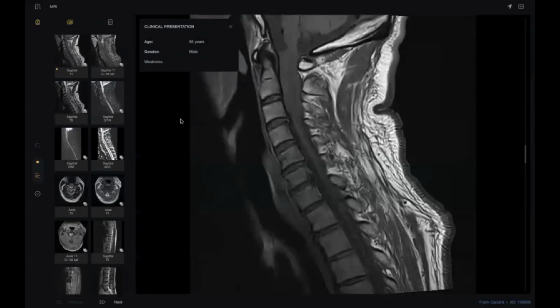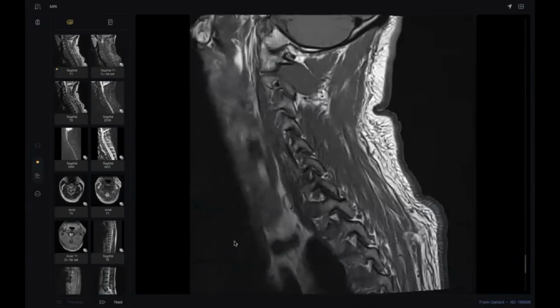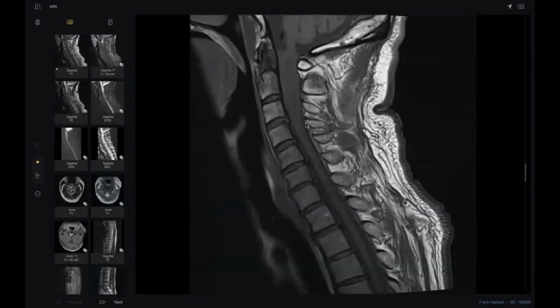Again, a 55-year-old male patient presented with weakness. Okay, so I'm presented with an MRI of the spine for a 55-year-old male presenting with weakness. I would like to have a general look before starting my comments. So this is T1. It shows an abnormal region in the craniocervical junction of the cord, expanding the cord with heterogeneous iso-intense signal to the cord.